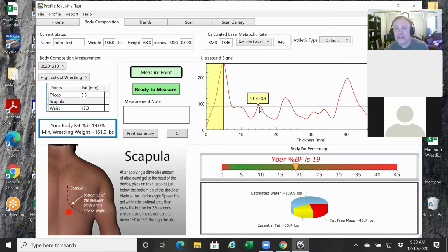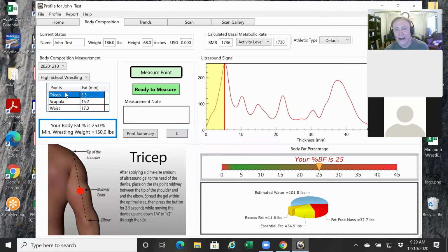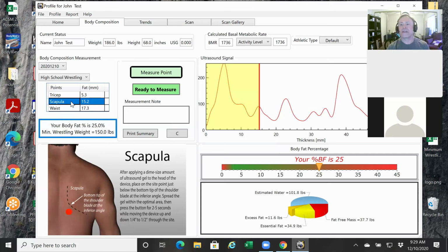Okay, so hypothetical. Let's pretend I'm just going to move this peak. I just clicked on a different peak down the scale here. Let's pretend I'm your athlete and we just got done and we're analyzing these graphs. We look at the tricep, first strong peak was selected, we're good. We'll go to the next one. Right away, guys, this should be a red flag for a couple different reasons. Just visually speaking, when we look at the graph, we notice that the red vertical line is on a different peak. It didn't recognize it for whatever reason, and a lot of times it's attributed to bad technique. Not always, but a lot of times. So we would need to make an adjustment to this graph.